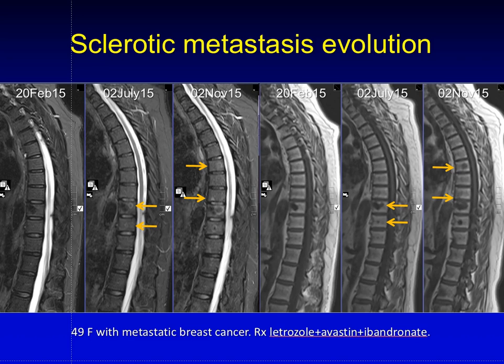And here is another patient with breast cancer, and we can see this halo develop as a lesion grows over time. So this is the same lesion. Posteriorly you see a new lesion growing, and that halo in fact is what we need to concentrate on. That's the area of osteolysis. That's the area where you have the highest cellular packing.